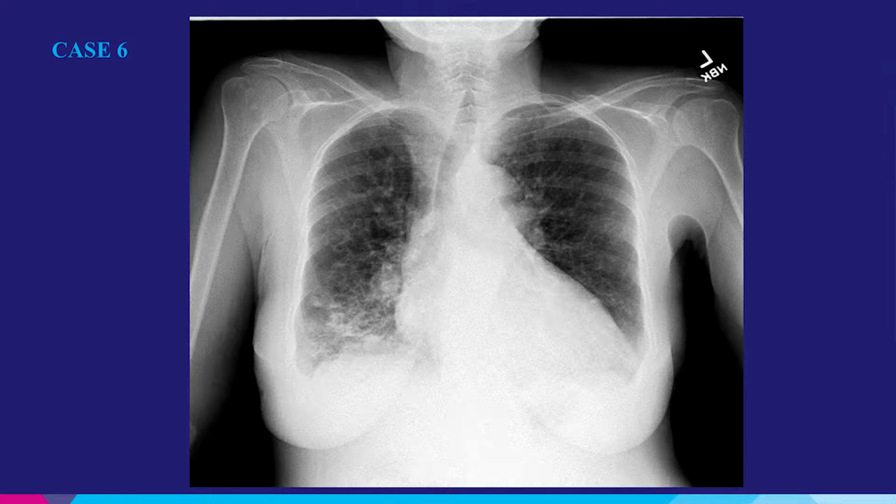As you can see, if you want to report this, there are a lot of possible findings that we can make. Let's say if I want to report this, you can see there are patchy opacities here, and some areas are even, let's say, tubular in shape. It could be atelectasis, could be pneumonia, and then looking at other areas, you see some possible centrally lucent areas.